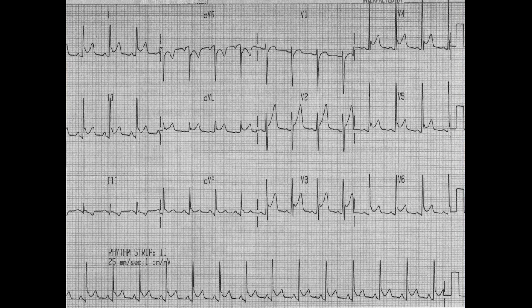And this EKG prints out for you. Again, at first glance, it might be a STEMI. And you might be thinking STEMI. But we have ST segment elevation everywhere. Is your patient having a heart attack everywhere at the same time? Probably not. So ST segment elevation everywhere. V1 doesn't look significantly elevated, but everywhere else we've got elevation.